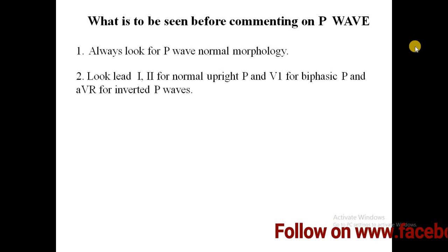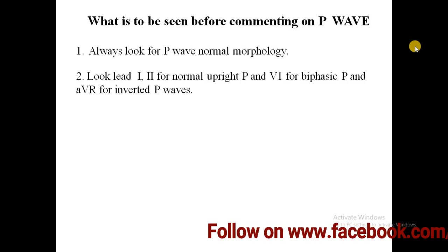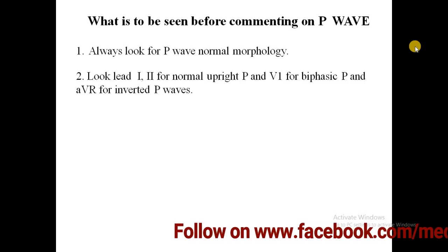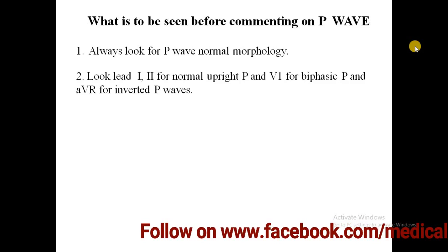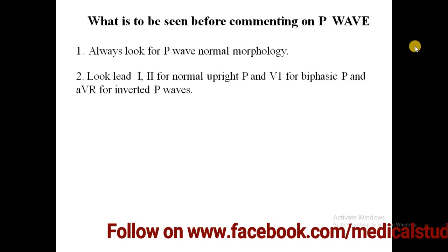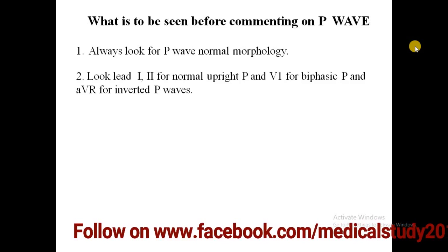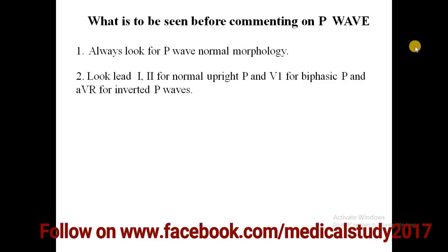So this P wave is to be seen mainly in lead 1, 2 for the normal upright feature of the P wave. For the biphasic feature we need to see V1, and for the inverted P wave we need to see AVR where it is normally inverted. Then sometimes the displacement or wrong placement of the leads may show some waves as abnormal, but actually they are not abnormal, they have been recorded wrongly because of the wrong placement of the leads.